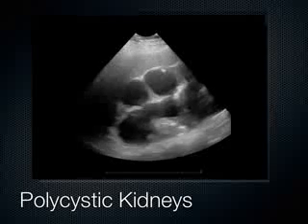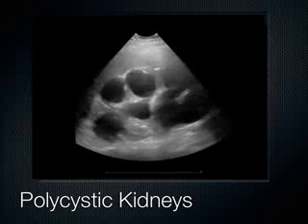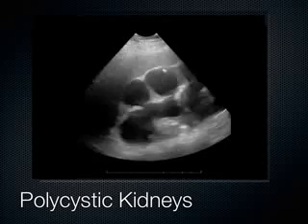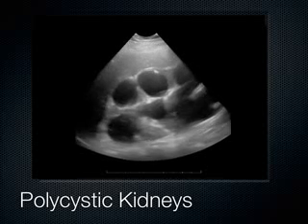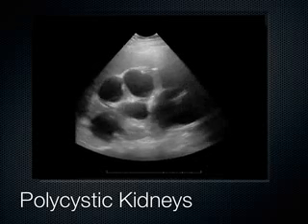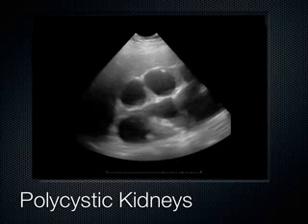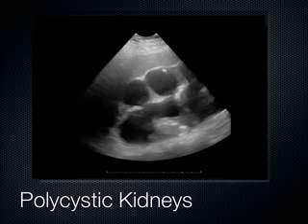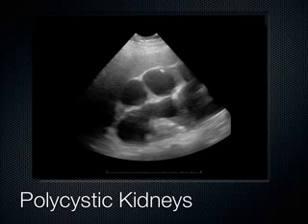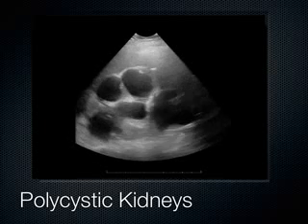You heard of polycystic kidney disease? This is what it looks like on ultrasound. These are all these cysts seen out here in the cortex. We can make that one here, this one here, this one here, this one down here. Polycystic kidneys, and it's bilateral. And you can see it also affect other organs. Sometimes you can see cysts in the spleen. You see them around the liver. Ovaries look like this when they have polycystic disease.